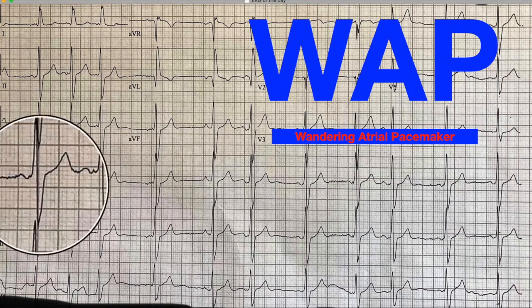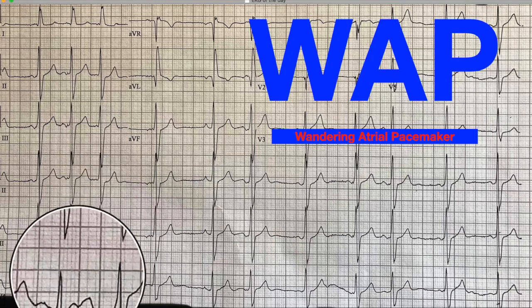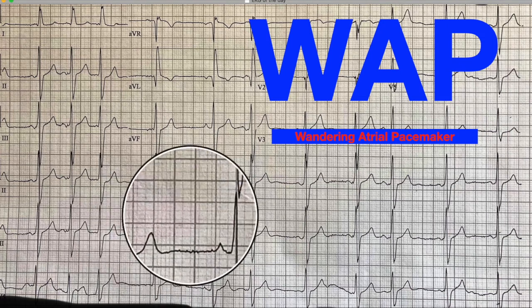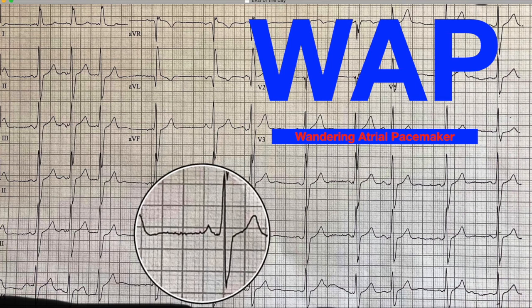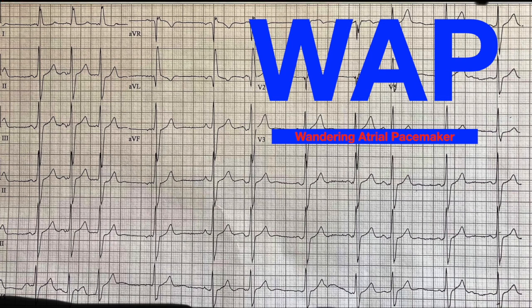You have one that, say, fires off more or less normally up here, or maybe it doesn't quite fire off normally. We don't even see one here. We're not sure where that one is firing from, but it's a normal looking QRS. We see maybe a little small inverted P wave here. We see a real sharp P wave here. In each case, and you notice too, the PR interval is a little bit different with each of these as well. So from different locations in the atria, there is some ectopic tissue that is firing off P waves, essentially. So that's a wandering atrial pacemaker.